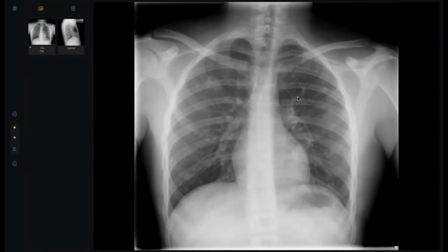I have been presented with a frontal chest radiograph for a skeletally mature patient with history of fever. After reviewing the radiograph, I cannot see any obvious abnormality, so I would go through my checklist. I can see a left retrocardiac shadow, a density seen in the retrocardiac area.